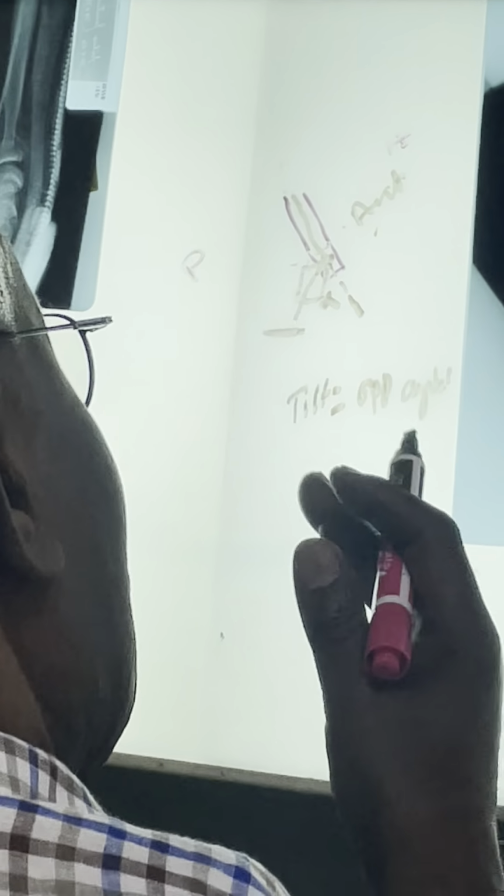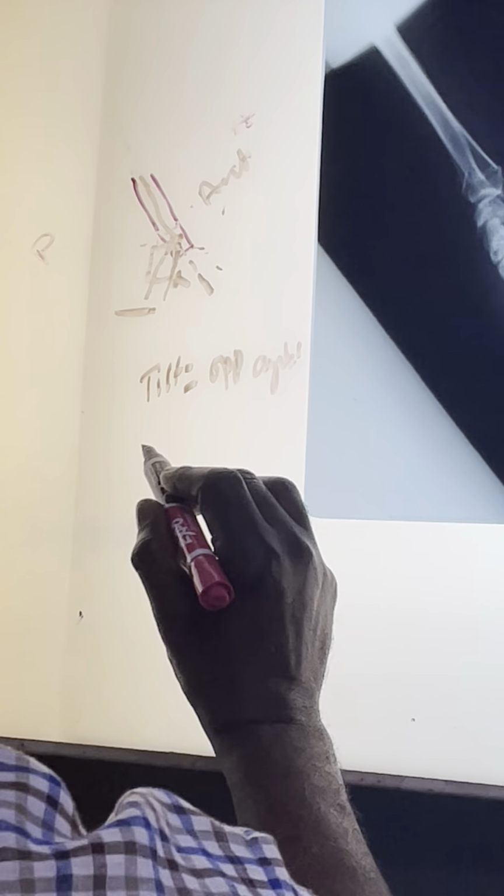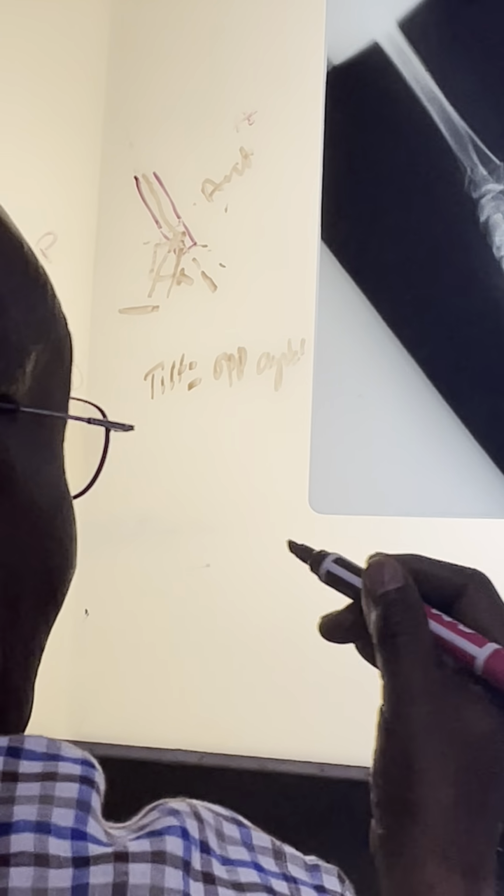But again, there's nothing wrong with using angulation. I still need to bring the fracture anteriorly. It doesn't matter which one you use, just understand the principle. So you see that? You see how it's tilted posteriorly? But it's gone from here to there, right? So in addition to being tilted, it's posteriorly shifted in a linear plane.